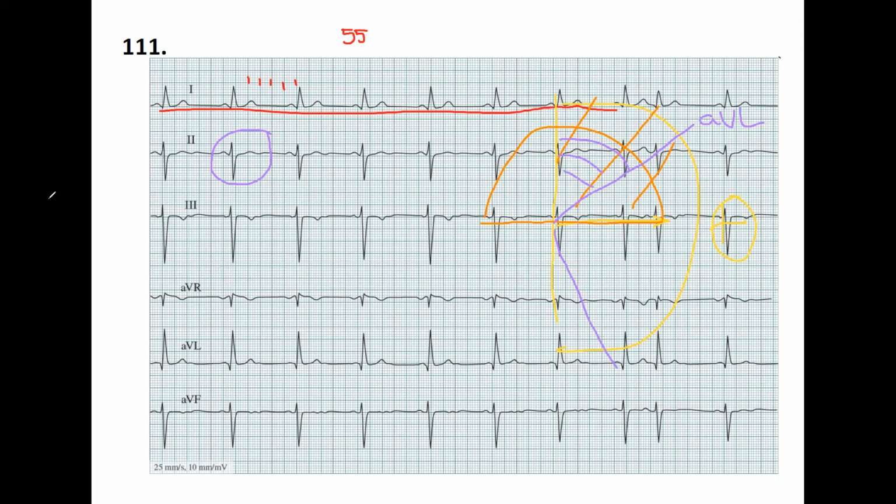Yes. Now, if you want to narrow down, you should look at AVR. One side of the AVR is 120. Another side of the AVR is minus 60. So by looking at AVR is negative, it means that you are located between minus 30 and minus 60, but it's still pathological left deviation. Okay? Understandable? Yes. More or less. Okay, good.